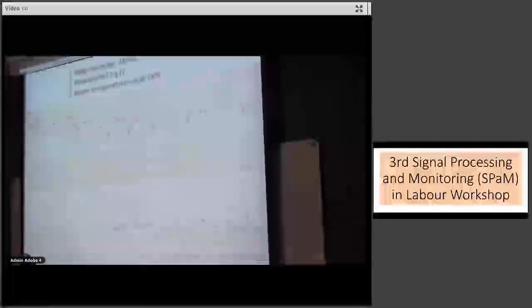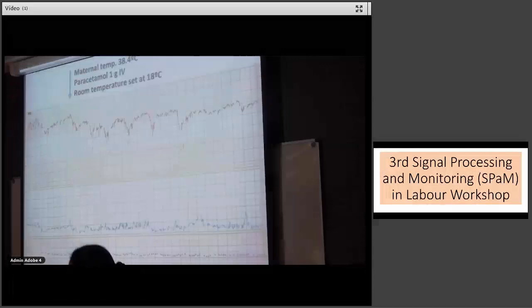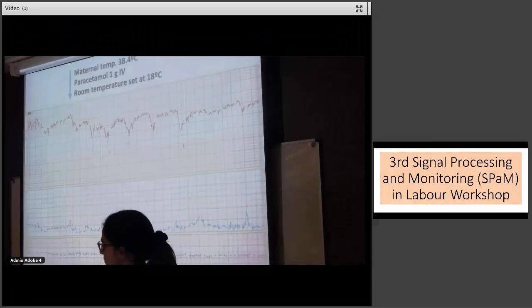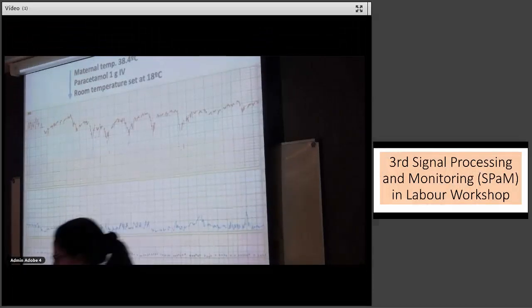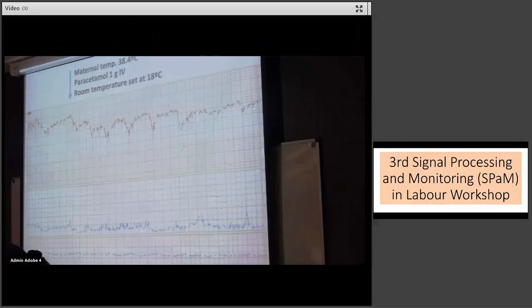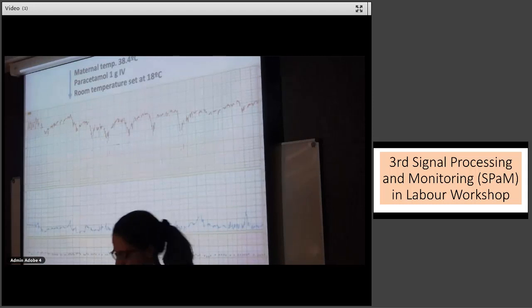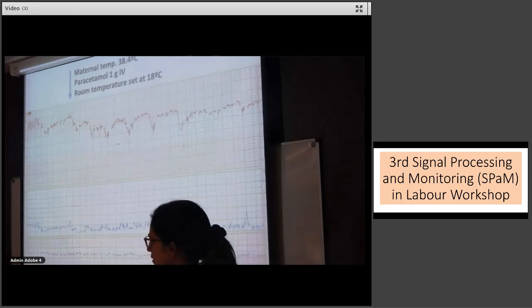But I'm just thinking that the original tachycardia, and you see it comes down, and first there's a deceleration. So my sense would be that there was... I don't know that it's important. The important point is that it recovers to something manageable and stable. Okay. Yep. Thank you, Barry.